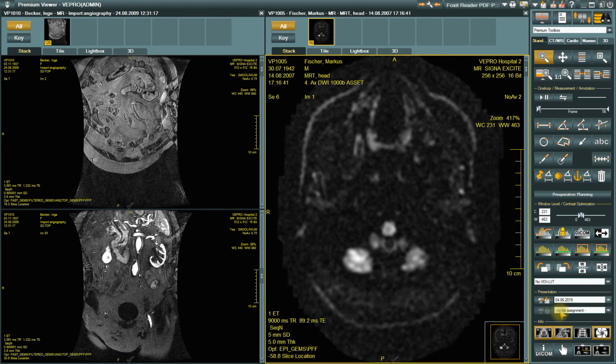You can use the List Assignment drop-down menu in the presentation area to assign your prepared image to the radiology presentation list. To save this as a new presentation, click on the Save New View button in the toolbox, and the presentation will be created within the open study.